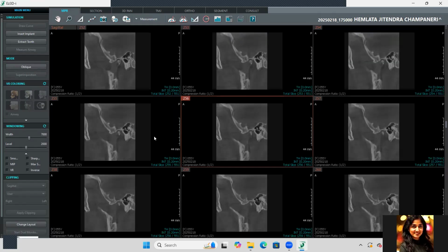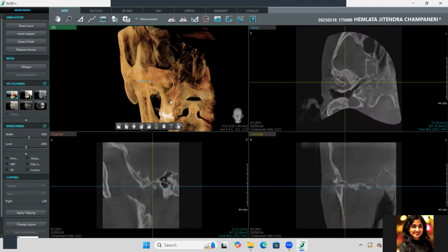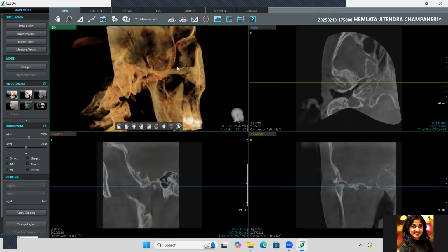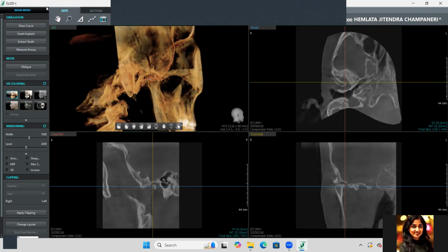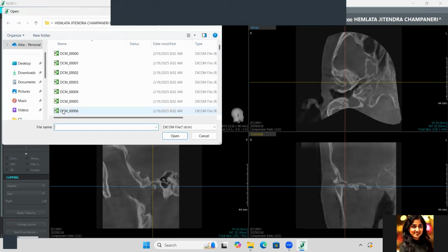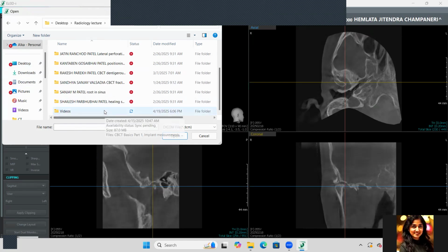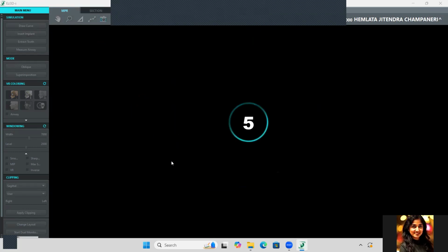It is very well visible here as well, sagittal and mediolateral. Here, because of overlapping, we cannot see much in the 3D section. And in the pan, there is nothing visible in terms of TMJ in X-rays. So that's about it. If you also have some interesting cases, you can share them with me. If you have any doubts in any case, you can share the CBCT with me for a second opinion.